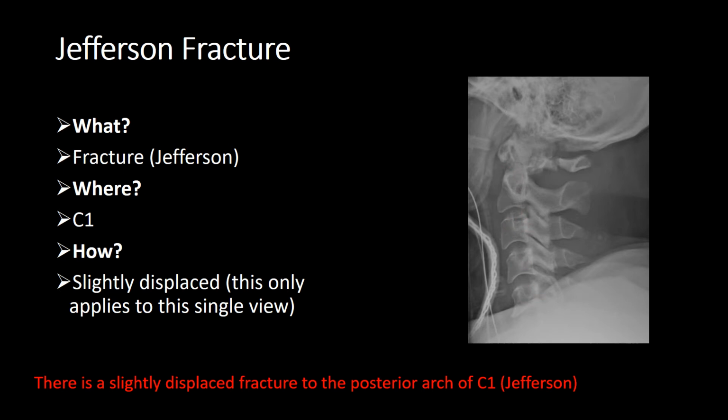So we only have 5 cervical vertebrae when we should be able to visualise down to T1. So in clinical practice, this cervical spine is not adequate. This is inadequate views. You would either need to repeat this view, or judging by the shoulders, you would need to do a swimmer's view.